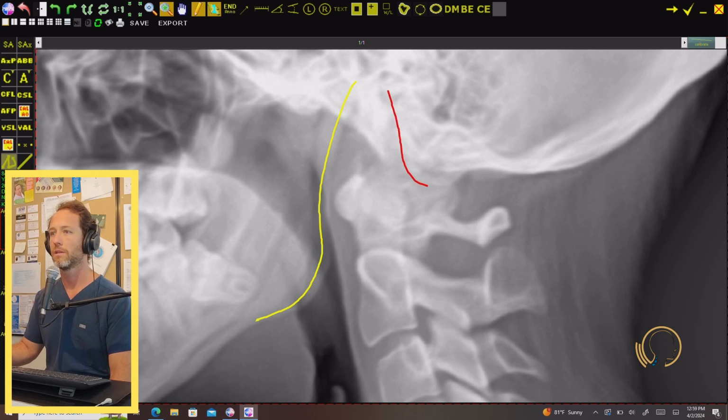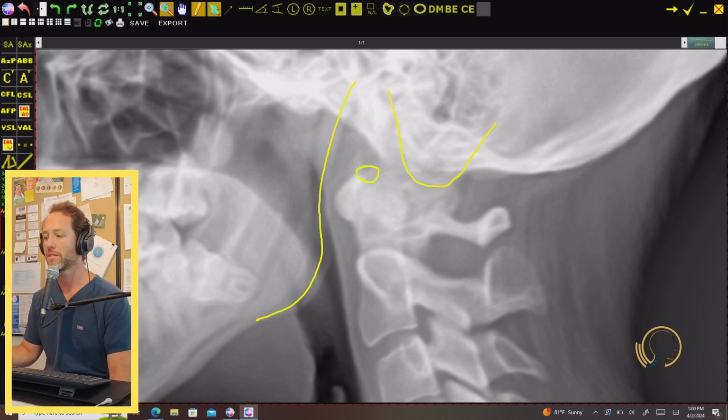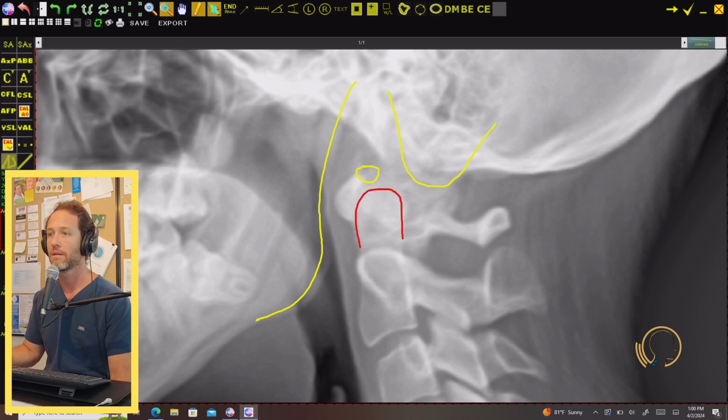Doing mastoid and that mandible, okay? So let's assume, because that's what a lot of us might be doing, that your transverse process is in the tragus notch. I can tell you looking at this already it's not, right? Because I can see, if I got the dens down here, all right, even visibly, before I get into how to do this, I'm looking at that posterior arch, and I'm seeing a lot of structure going on around here. All right.